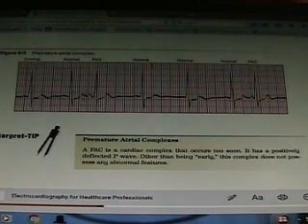Does that look normal to you? Right? Typically a P wave is 0.1 millivolts high. This one's almost 0.3, or 3 small boxes. Something's up. So if everything looks normal, except that P wave looks really high and it happened really too early, then we know this is a PAC.